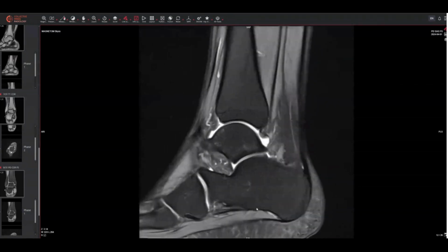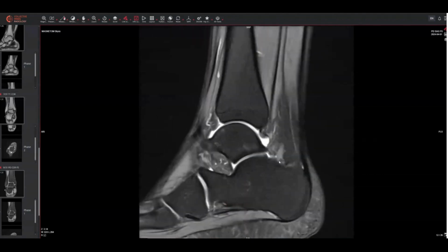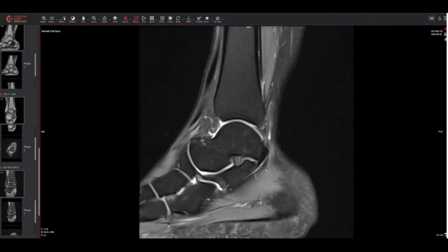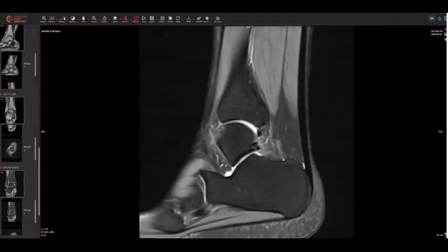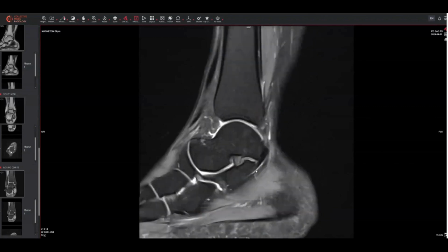uncompensated biomechanics. Notice in this patient also this very atypical muscle that is running from the posterior crural fascia to the quadratus plantae, another cute feature that supports that there are developmental variations in this patient.